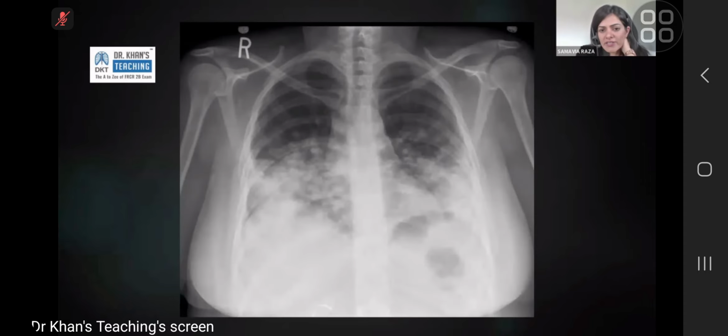Again, I'll open up the chat, and this just goes, hopefully, to drive down the point that an appearance can be deceiving. So one, I want you to describe the abnormality a little bit if you can, but give me your top differential for this one.